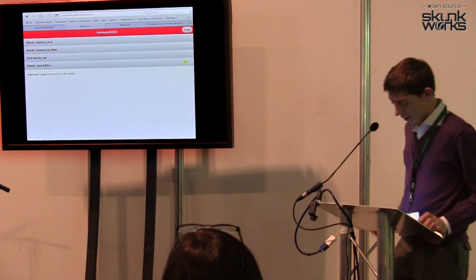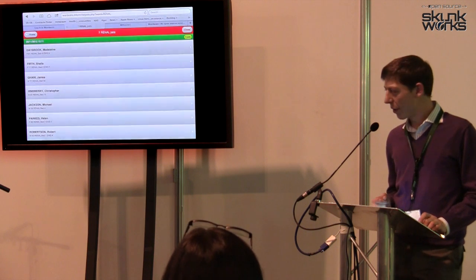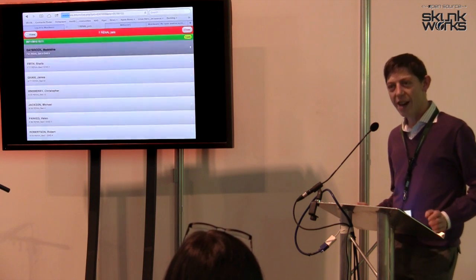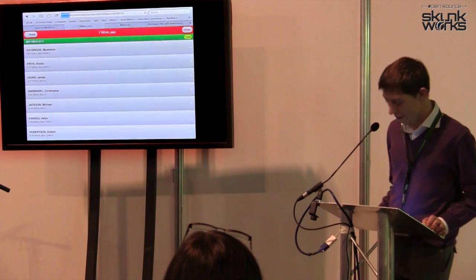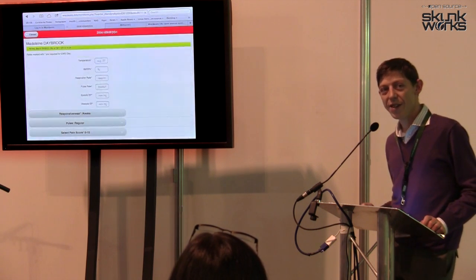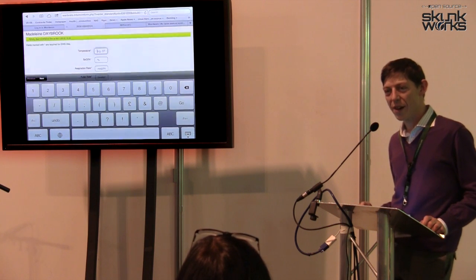So I've been working with one particular patient today. I've done quite a lot of observations, but because I'm not really a clinician, I haven't really been able to make this person particularly ill yet. So if we do have any clinicians here, if they want to shout out some values for this to give us a really high early warning score, then let's do that together as we do the observations. Have we got any clinicians in the audience? Wendy, let's do some EWS obs for a sick patient.